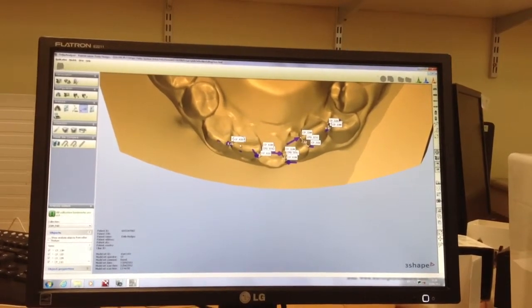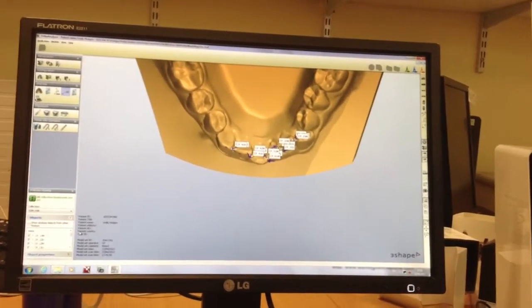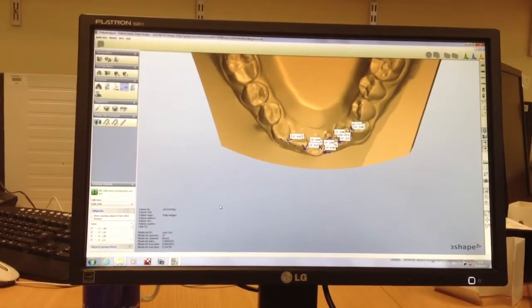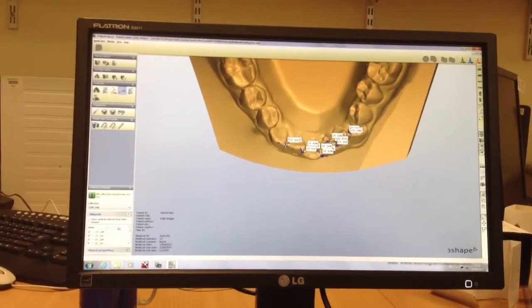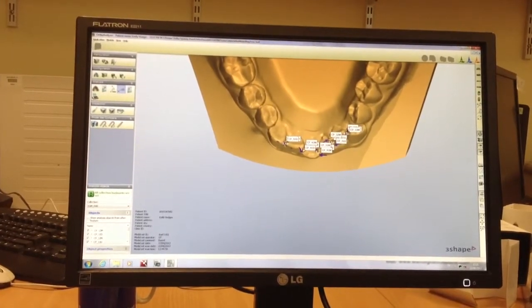So this is actually a program that asks you in the correct order for the different measurements. Exactly. Yeah. Really what we're doing is selecting the landmarks, and the software then knows that it needs to record the distance between each landmark. That list of landmarks is presented here.